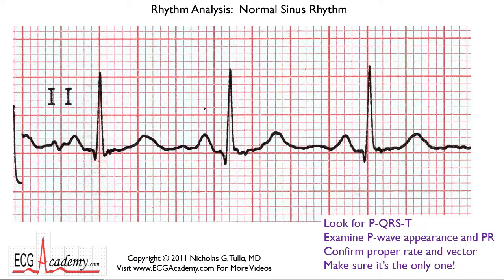Okay, so in lead 2, you can clearly see that the beats are fairly regular. You can see the QRS complex right away because that's obviously the biggest signal. So look in front of it, and that's where you should be finding P waves. And then look after it, and that's where you should be finding T waves. So if we measure the PR interval here, it's 1, 2, 3.5 small boxes, so it's about 140 milliseconds, and that's normal. The QRS complex, this is just practice for you guys, is maybe 80 milliseconds.